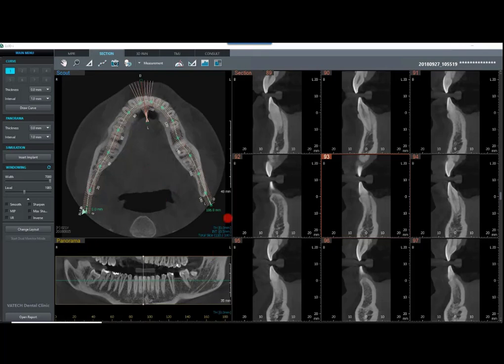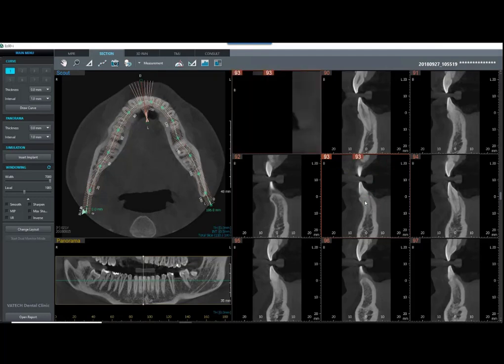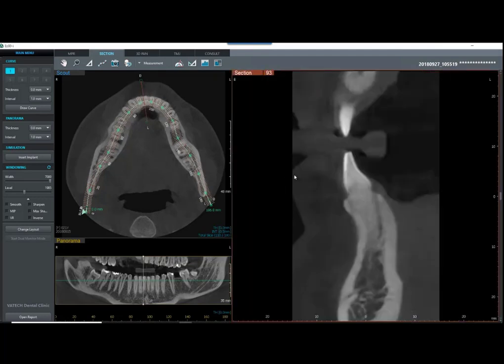Note down here, my right side and my left side, and all my slices. So right here, slice 0 all the way through 187. This vertical red slice is going to be my red slice over here. Slice number 93 also correlates to my red slice down here. Everything's going to be labeled, our buccal and our lingual. And I'm going to hit escape. And what I can do is go ahead and double click here to enlarge our window on that. So that's kind of an overview of the 3 windows here.